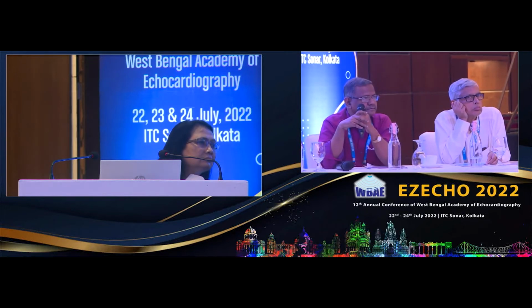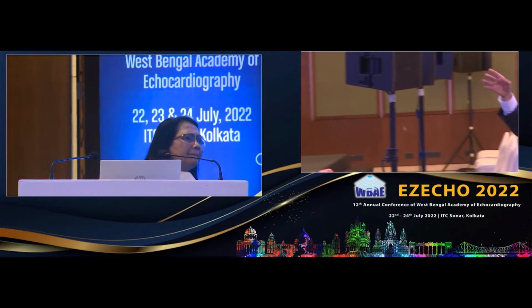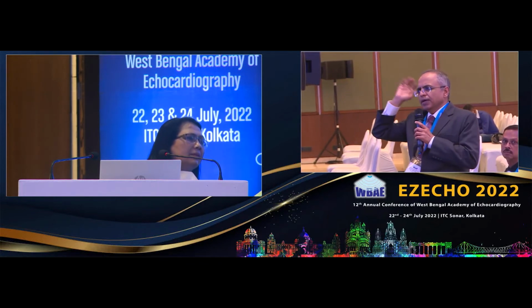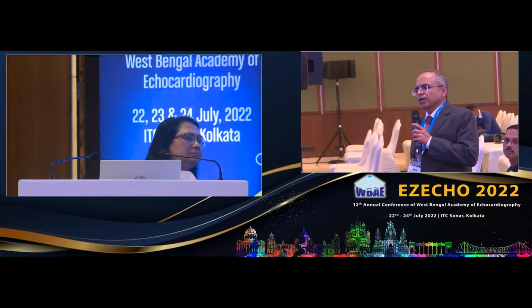Secondly, your T2, T1 maps, just qualitatively, even if you look, you don't have to put the ROI. Even if you qualitatively see, they were showing all very light color in that area. So we knew that there is an edema there. This edema memory persists for almost 7 days to 10 days.